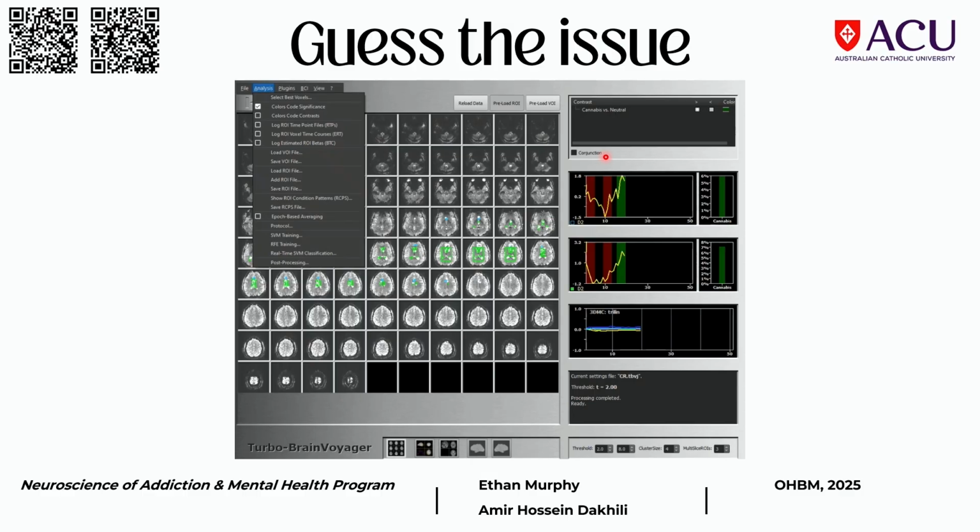Yeah. So the thermometer won't be displayed, but the reason it won't be displayed is because MATLAB is not able to get the feedback value scores. So what box has not been checked here? It's probably hard to see. Okay, but we'll give you a koala for that. But it's the log RTPs.